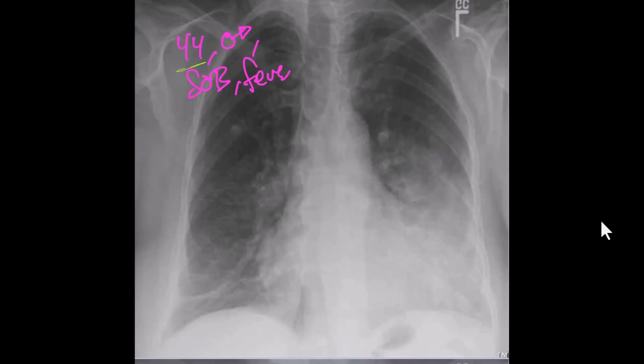So another X-ray of a 44-year-old male presented to ED with shortness of breath and fever. So you can see that there is an airspace disease here on the left side of the lung with a consolidation, so confluent, hazy, cotton-like opacity with air bronchogram and indistinct borders. And that's in contact with the left border of the heart, so it obscures the left border of the heart here. So the left border cannot be distinguished on the left side. So that is again called silhouette sign. Because the pneumonia and the heart are the same radiographic density, the border between them disappears.